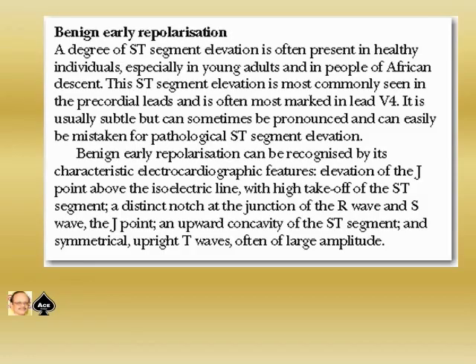Now, benign early repolarization is a degree of ST segment elevation often present in healthy individuals, especially in young adults and in those of African descent. This ST segment elevation is most commonly seen in the precordial leads and is often most marked in lead V4. It is usually subtle but can sometimes be pronounced and can easily be mistaken for pathological ST segment elevation.